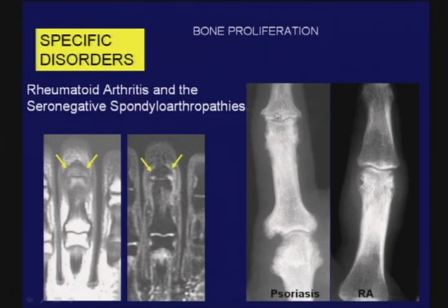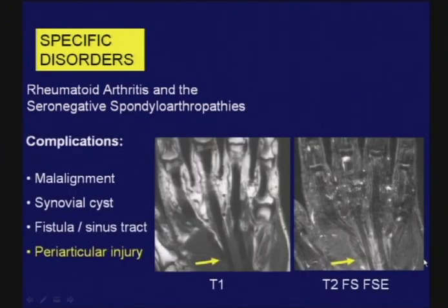And that's nicely shown in the radiograph. So perhaps the marrow edema is the stimulus that produces the bone proliferation here on an MR. We can also see these mouse ears about a diseased interphalangeal joint. So marrow edema in the seronegative diseases.